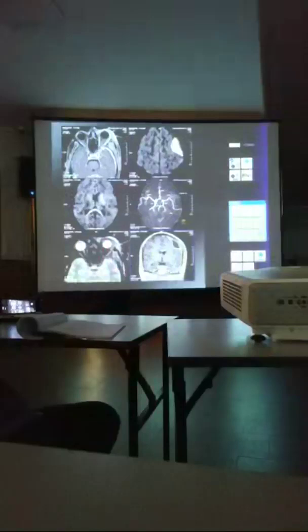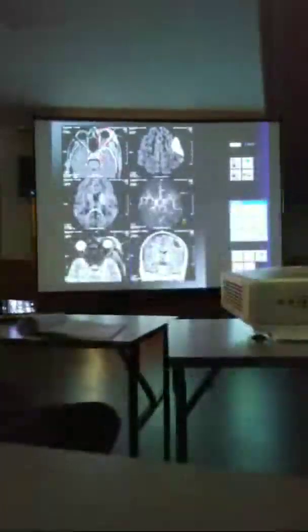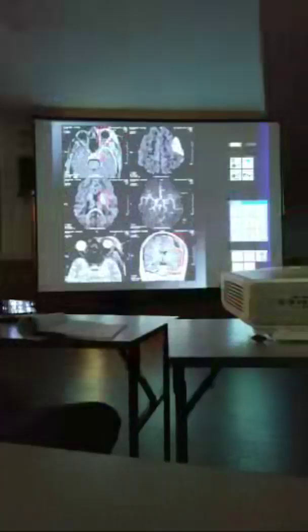This boy presented with right side hemiparesis, pre and postseptal cellulitis. We can appreciate the extensive pre and postseptal cellulitis, cavernous sinus thrombosis, vasculitis of the ICA plus lenticulostriate branches presenting as infarct, large epidural empyema. You can see the enhancing pachymeninges plus leptomeninges over here. This is all a very classical manifestation, but the source is a small furuncle in the nose that produced all these problems over here. So you should always think about these things.